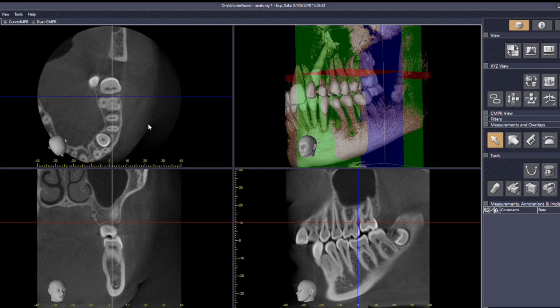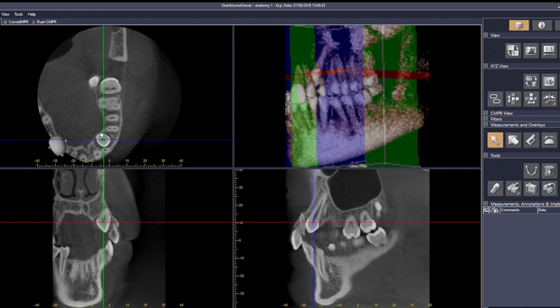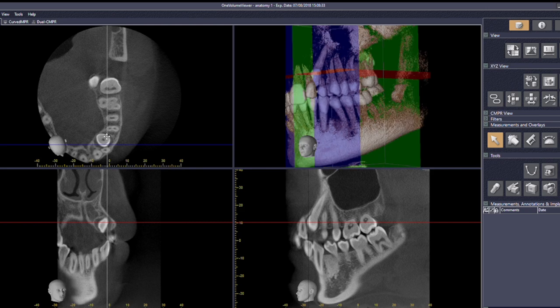How do we line things up? We target it in the axial plane. So what I mean is, there's the tooth, this is my axial plane, and I'm going to put the coloured lines on the centre of the root canal. Can you see here I'm bang on the middle of the root canal. I don't want you to be somewhere in the region like this. I know this is touching the 3, but it's not enough. We need it to be bang on the root canal.